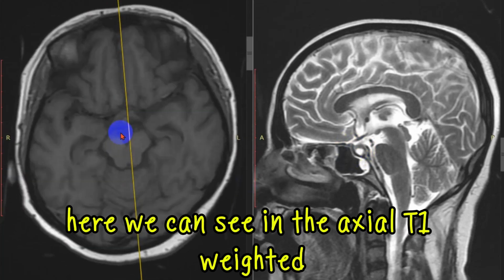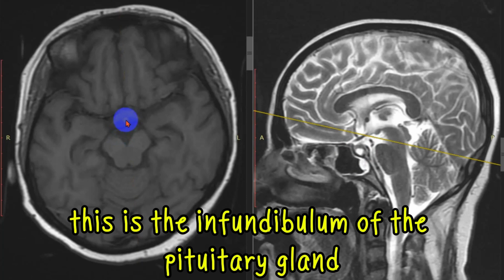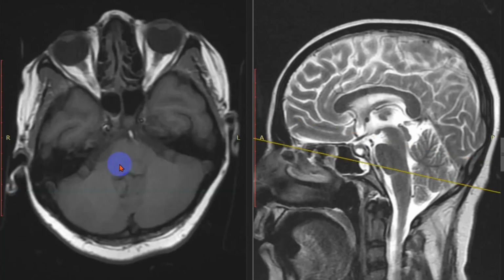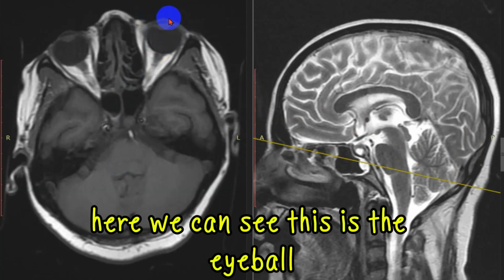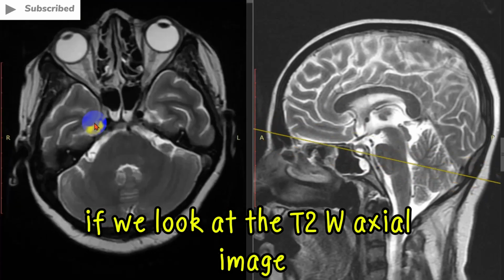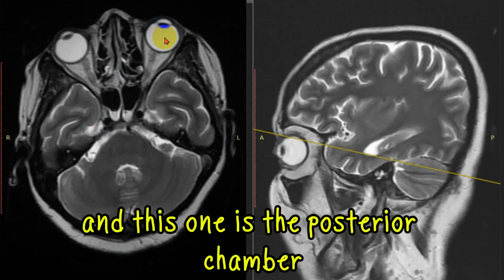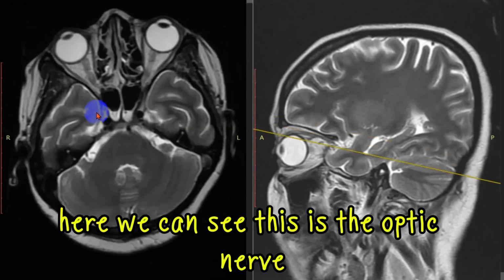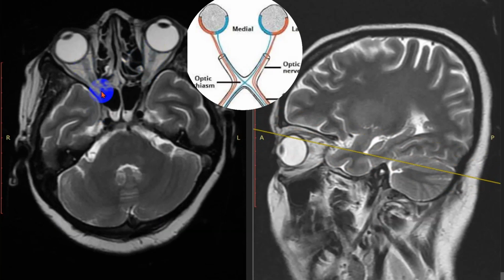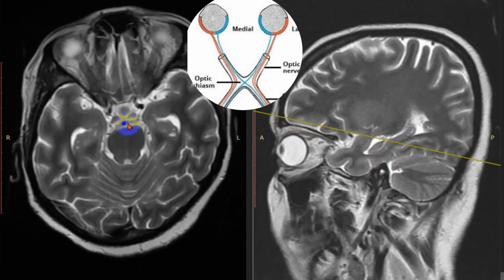Here we can see in the axial T1 weighted, this is the infundibulum of the pituitary gland, and in front there is the optic chiasm here. Here we can see this is the eyeball. If we look at the T2 weighted axial image, here we can see this is the lens of the eye, this is the anterior chamber, and this one is the posterior chamber. Here we can see this is the optic nerve, which comes backward and joins to form the optic chiasm just in front of the pituitary infundibulum.